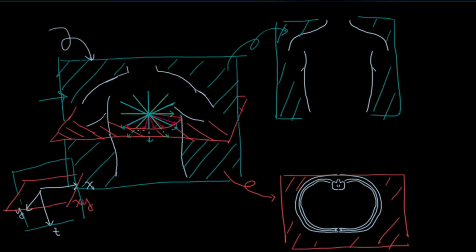It's kind of a lot, but on the XY axis, we got all these red ones here. And in the XZ plane, you see all of these. So how that corresponds to the body and the cross-sectional areas, to be able to see those a little bit better, is like this, where you have your V1, V2, V3, V4, V5, V6. You got your lead 1, lead 2, lead 3, lead AVR, AVL, AVF, and this is how they would look in three-dimensional space.